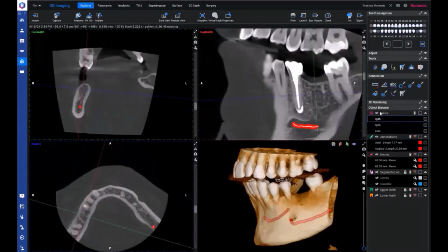And apart from these view savings, everything now is saved in the 3D module, but there might be, of course, times that we also want to save, for example, for reporting and printing needs, some specific view or the whole 4 views that we have here to the 2D as a 2D image.